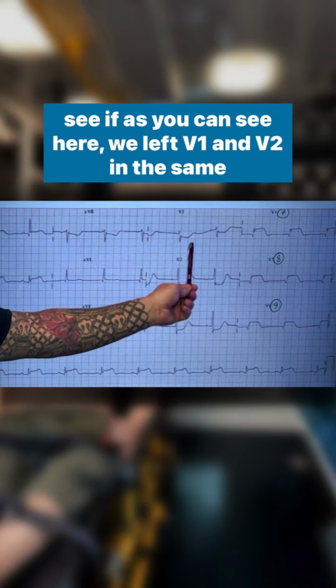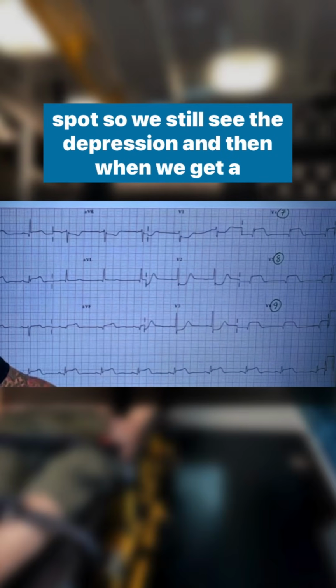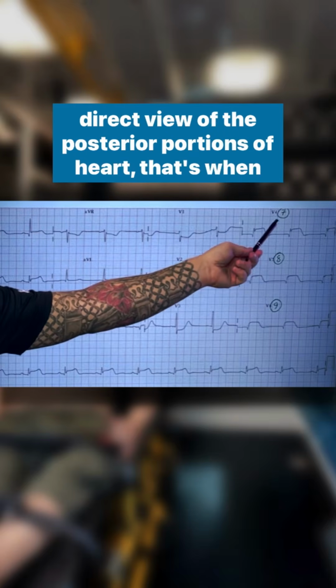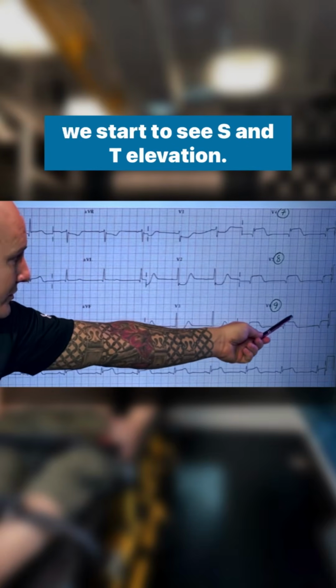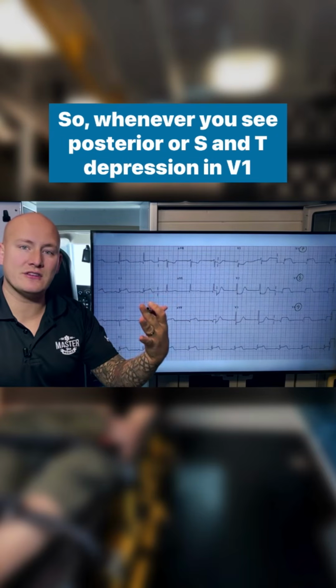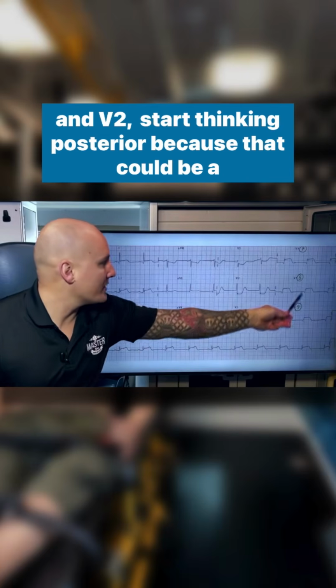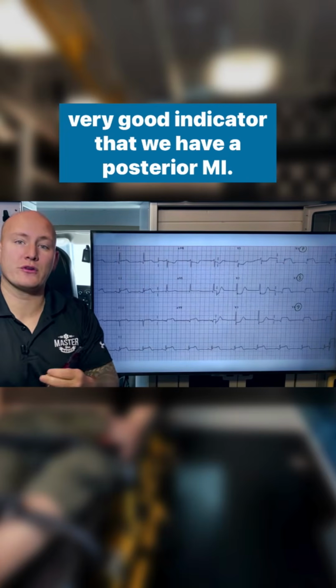As you can see here, we left V1 and V2 in the same spots, so we still see the depression. And then when we get a direct view of the posterior portions of the heart, that's when we start to see ST elevation. So whenever you see ST depression in V1 and V2, start thinking posterior, because that could be a very good indicator that we have a posterior MI.